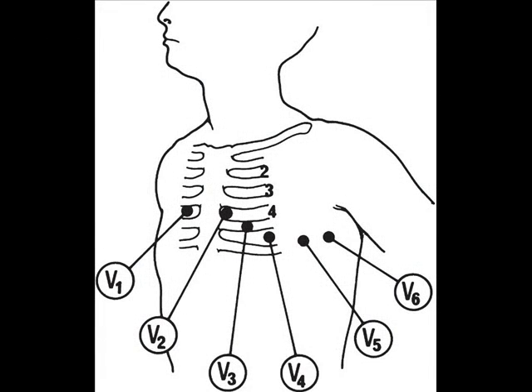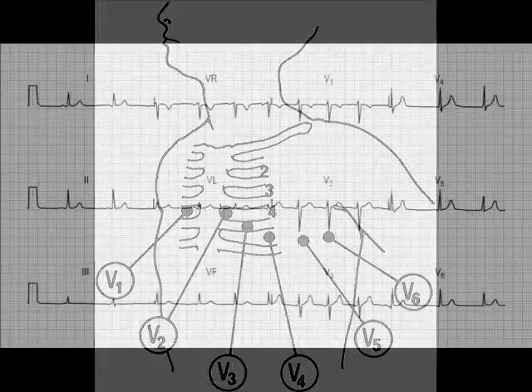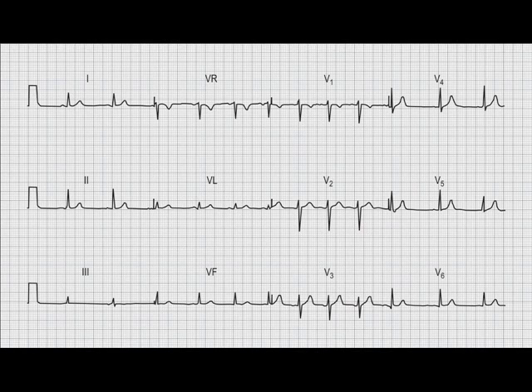Again, it's the general direction of depolarization through the heart, that is the cardiac axis, and V1 senses most of that depolarization heading away from it and gives you a very downward or negative QRS complex, and V5 and V6 sense most of the depolarization heading towards them and gives you a very upright R wave and hardly any S wave, sometimes none at all. So the chest leads progress from negative to positive from V1 or C1 to V6 or C6.